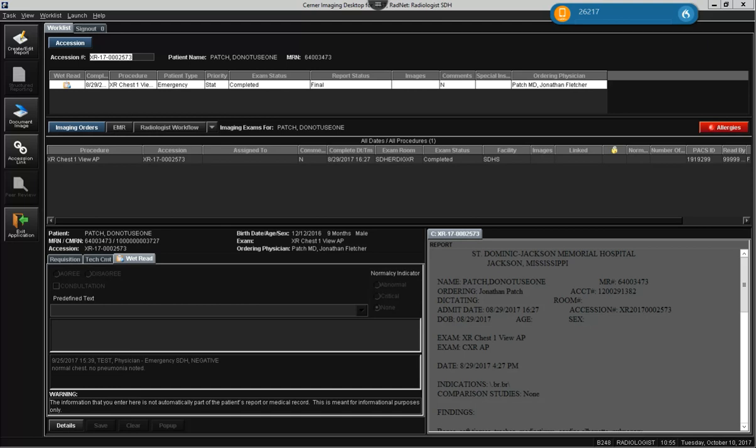Welcome to Cerner Radiology Training video number 3. In this video, we'll focus on navigating Powerchart, documenting an immediate procedure note, and Autotext both in Cerner and in Dragon.